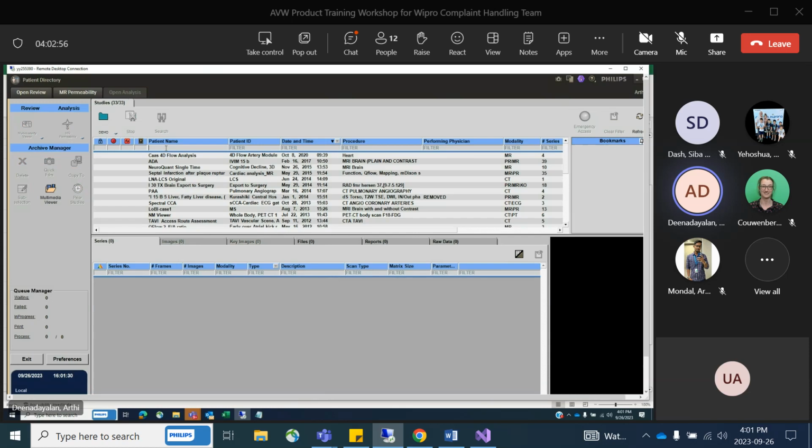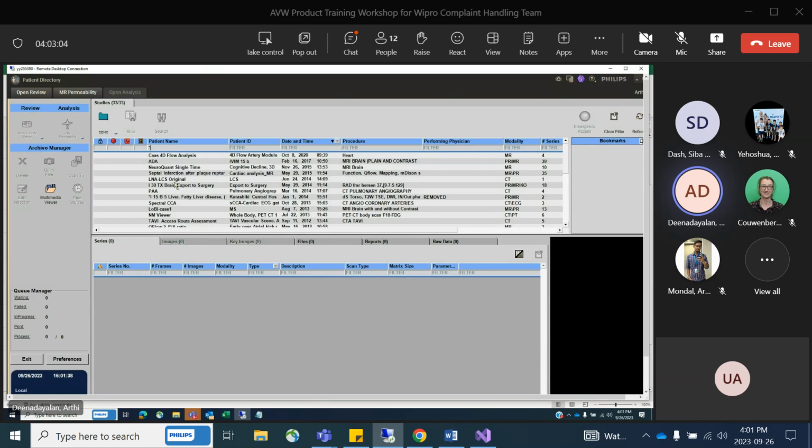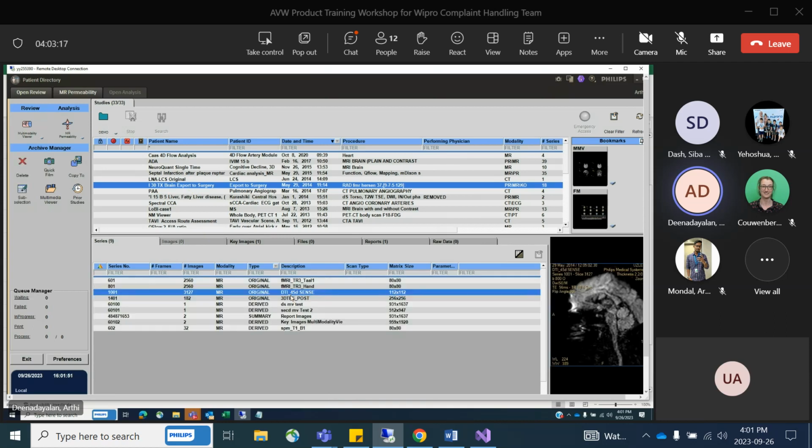Next, for diffusion, you should load star I. Star I15 is not there. Okay, star I. You can choose this data set, star I30TX, export to surgery, but just load this data set. In this data set, you should use this series. By default, if you load, it will take this series only to the study to MR diffusion. So load this and just play around with that. And the above two series can be loaded into fMRI. Load it into fMRI and just do those functionalities, whatever I was trying to explain.